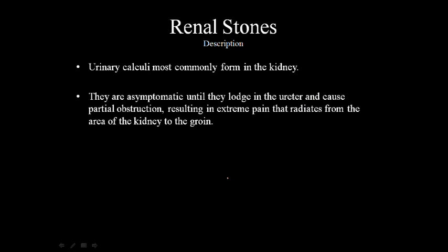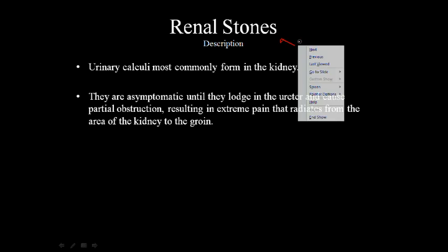So if we move on from the urinary inflammatory processes, we actually are going to talk about renal stones now. One of the most common things that you'll do a CT for, actually it is probably the most common exam that you'll do, arguably against a CT head.